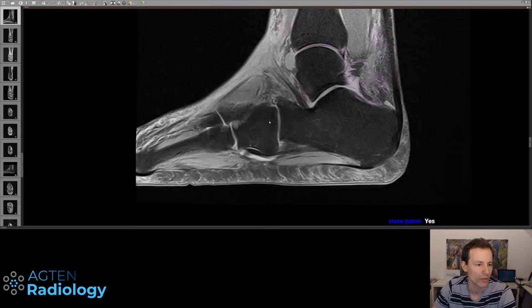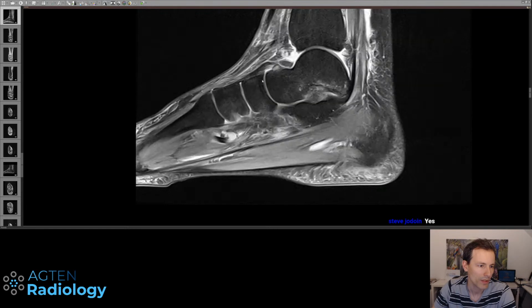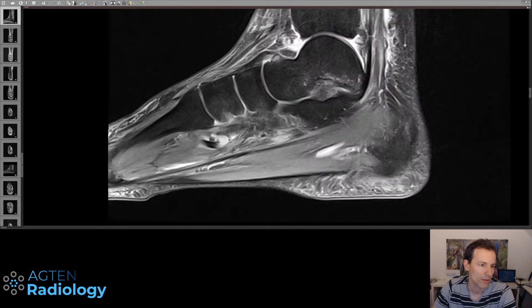So we have injury to this joint. Now we really have to check the talo-navicular joint, and what you can see here is this kind of elevated cortical bone here. So this one here and some high signal below it. The joint capsule itself is this one here, attaching to this kind of cortical bone here. And again, we don't see bone marrow edema in the talus itself.